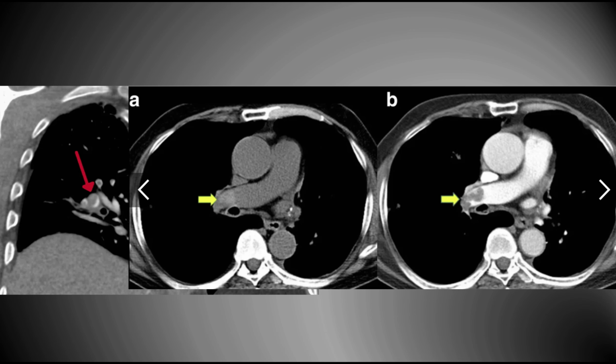Now, this is something that radiologists do to make this diagnosis. This is not the job of the ICU doctor. The ICU doctor needs to recognize there may be a pulmonary embolism and order a CT pulmonary angiogram. Chest x-ray is just not good enough. You're unlikely to see it. In this situation, this patient will need high-dose anticoagulation.